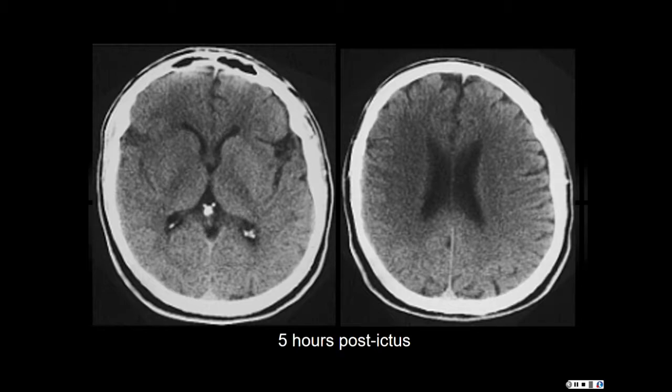If you knock out the caudate nucleus, thrombus is right here. If you knock out the temporal lobe and parts of the frontal lobe and the basal ganglia are spared, this is very crude, but I just want you to get the idea. This is where the thrombus is.